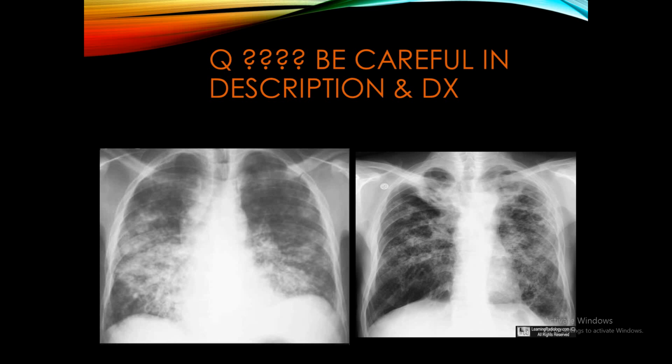We have two chest X-rays, both of them showing diffuse lung pathology. إذا تلاحظون chest X-ray اللي بالleft, the patchy opacifications is in the middle and lower zone, بينما in the chest X-ray to the right, the patchy opacifications is in the upper zones and it contains lucency which is due to the cavitary lesions. فإذا both of them are bronchopneumonia، لكن البرونكونيومونيا chest X-ray اللي بالرايت واللي هو distribution مالته to the upper lobes, this is usually due to the TB, while the other one is due to the bronchopneumonia اللي هي العادي.